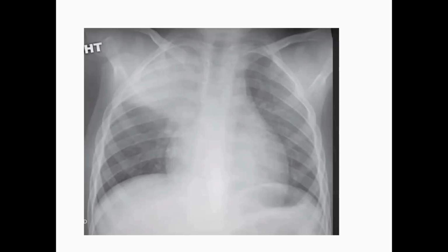So usually the feature of the consolidation of pneumonia is homogeneous opacity, like this. Look, it's a homogeneous opacity. For sure, in the early signs of consolidation of pneumonia, it will be heterogeneous, because it's early, until it involves the whole segment or lobe. Usually it's homogeneous opacity, and it's lobar or segmental, involving the upper lobe, middle lobe, or lower lobe.